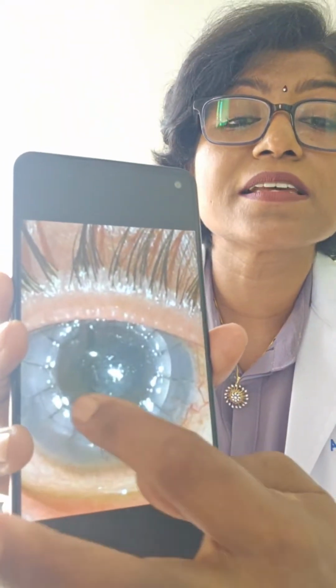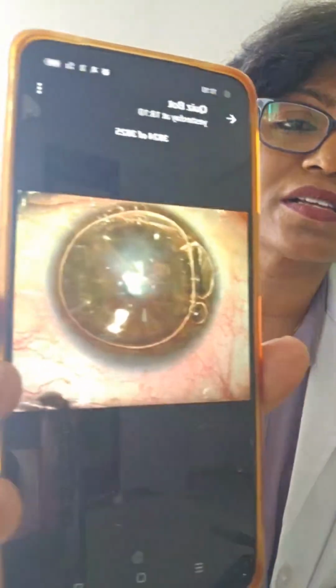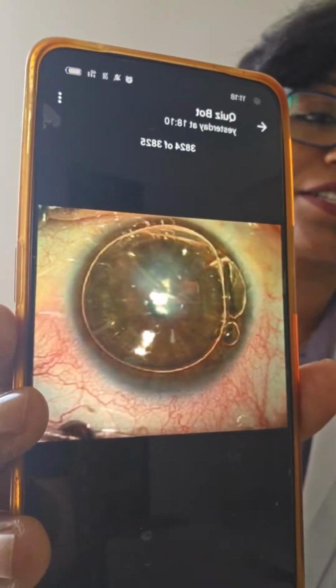Okay. Now, intracorneal ring segments, I've put another video. I'll share the link later. So it is not intracorneal ring segment. Definitely not. And how does a penetrating keratoplasty look like? A penetrating keratoplasty is going to look somewhat like this, because you will have sutures to keep the graft in place. This is a fresh keratoplasty, so it's a little boggy, those tissues, but there are no sutures at all here, so it cannot be a full thickness or penetrating keratoplasty.